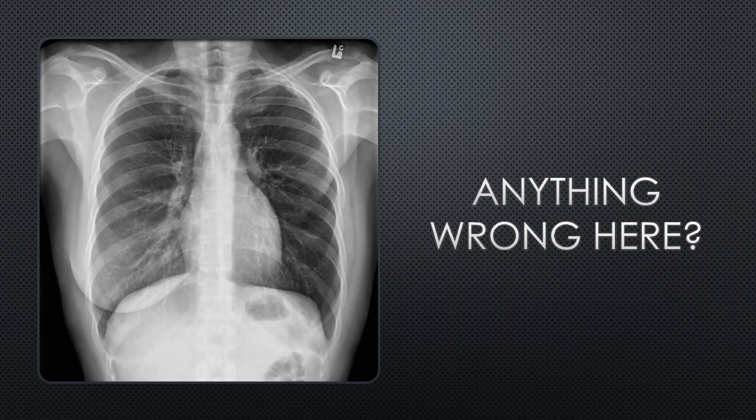Good. Pause your video and have a think if there's anything you see abnormal in this plain film and what it might be. Okay, so this one, yes, it's actually a patient who had a mastectomy from breast cancer. So I'm not sure if you can appreciate here, but the breast on this side is missing, and so it's a post-operative scan, but otherwise the lung fields are actually clear.